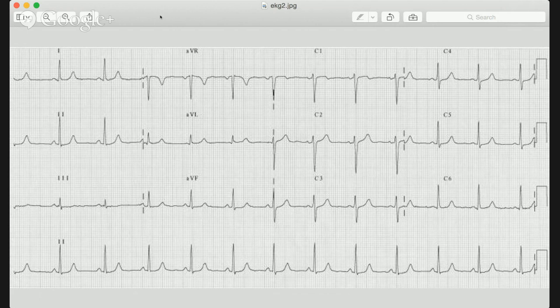Okay. All right. So moving on to step number 5, and our final step, we're going to look for ST segment depression and or elevation in any of these leads, as well as inverted T waves and the presence of any Q waves. So we'll start from lead 1 and work our way through lead 1, 2, and so on. Looking at this, there doesn't appear to be any ST depression or elevation in leads 1, 2, or 3, as well as AVR, AVL, AVF, or any of our chest leads. There's no depression or elevation. Do you see that?